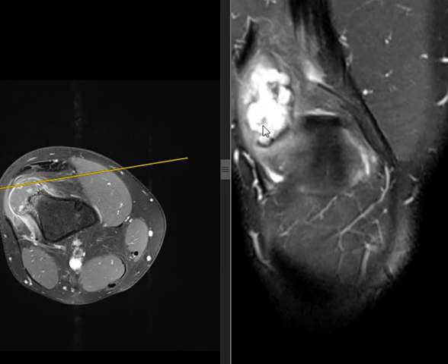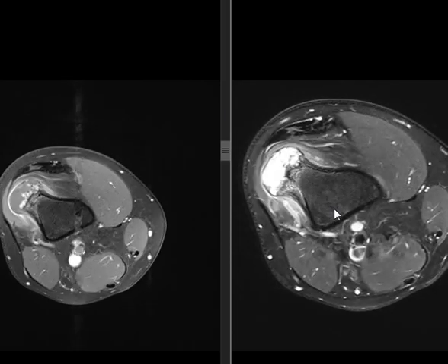It's cartilage, okay? And if we go to the axial T2 fat sat or proton density, you can see easily, if we measure it here, that this is around 15 or 16 millimeter, something like that, and you can see the edema of the surrounding soft tissue indicating some active process here.